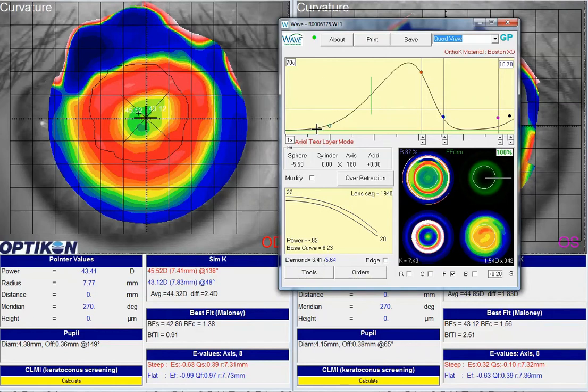We've got a little bit more room inside the pupil before we get past the 20 micron line where the graph really starts to tilt up. So this should enlarge the zone a little bit. The other thing we want to do is decrease sagittal depth. So we'll lift the periphery of the lens a little bit. I like to lift the edge to make sure that we're not losing contact of the back edge of the reverse curve. We want good seal off to get good movement of tissue.